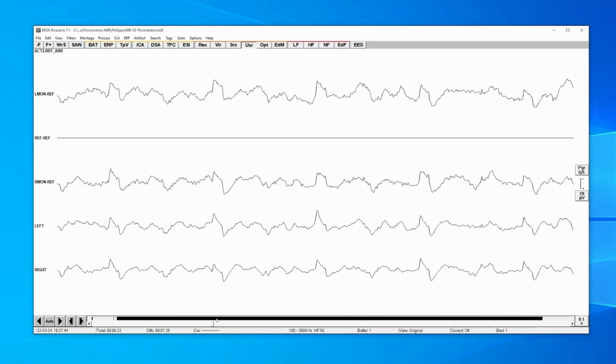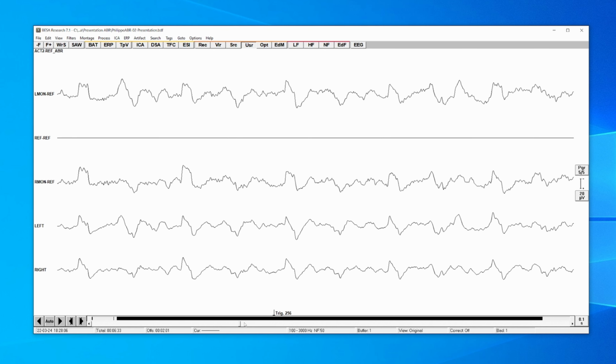When we scroll into the waveform, suddenly we can see triggers coming through. Now, remember when we opened the Surpass triggered file, which used a TTL trigger into the USB receiver because the EMS Surpass had a trigger output, and we hadn't compromised the safety of the subject because we're going the USB way, the digital triggering way.